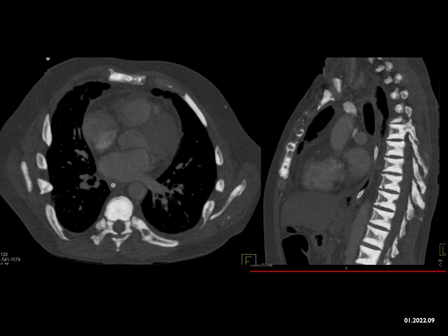What are we dealing with? I guess you can think about prostate cancer if this was a male and the patient was of the right age range, but this was a younger patient. But more importantly, the appearance of the vertebral bodies has kind of that V-shaped configuration, and usually the entire body would be involved with prostate.